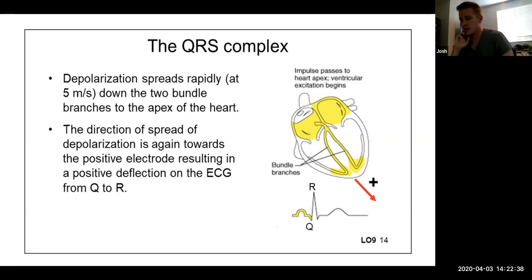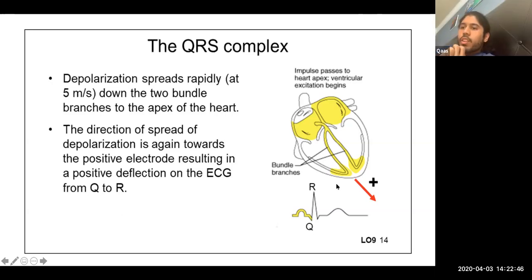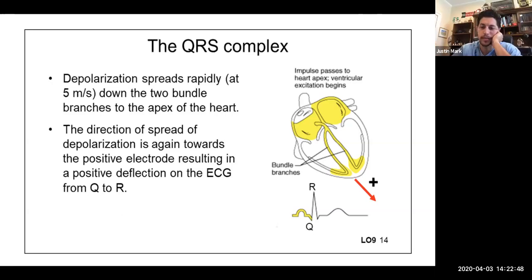So is it maybe that lead 2 doesn't typically have a Q, or a negative Q? It has a flat Q? It all depends. There's so much variation. No two hearts are going to be alike. For practical purposes, that little difference doesn't make that big a deal, because we do get 12 leads and we get to see the electrical activity all throughout the heart. So as a teaching point, sure, we could spend time on that, but I don't know if it's worth it.